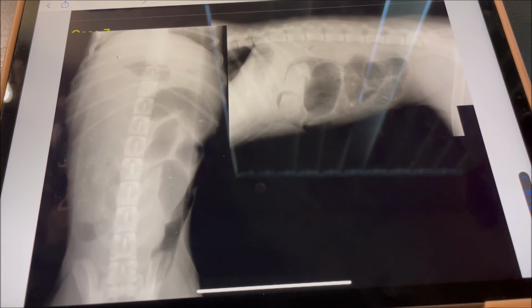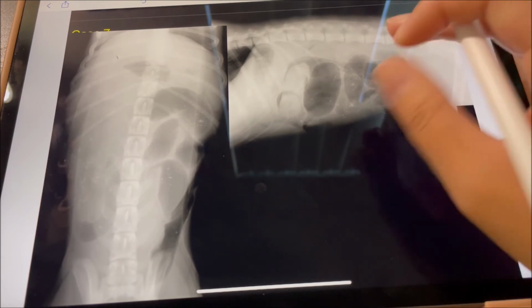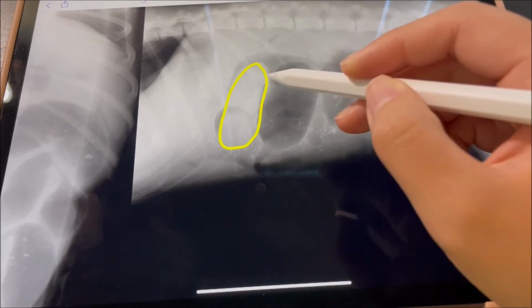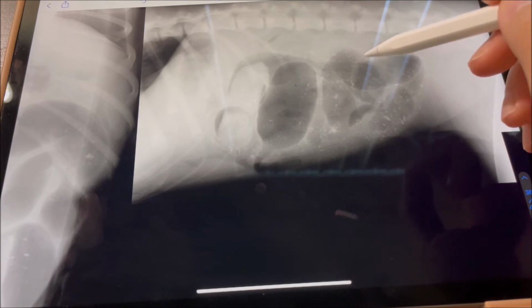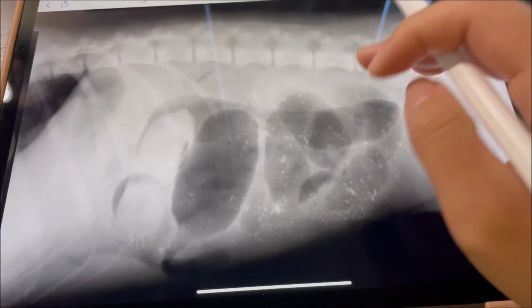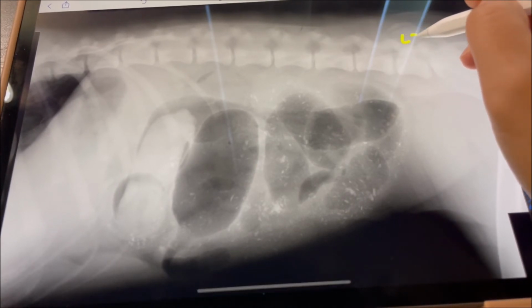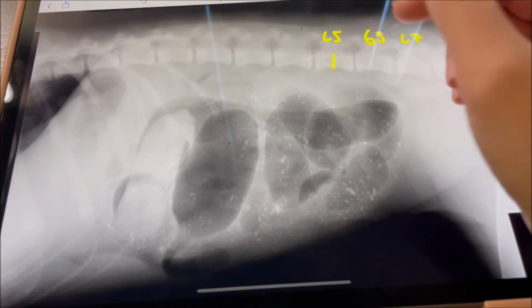So there is a soft tissue mass within the lumen of the bowel loops. This thing, which is really weird. There's a possible obstruction there. The bowel loops definitely look dilated with all these gravel signs. And remember to check if it is pathological enlargement. We can check that it is larger than 1.5 times the height of L5.